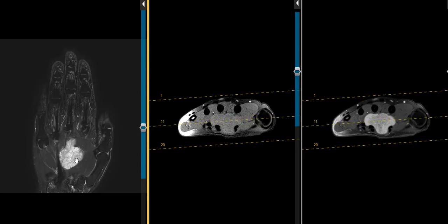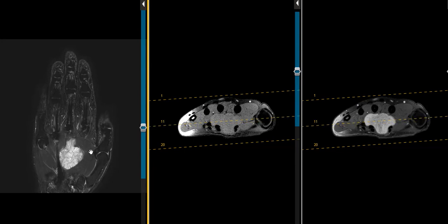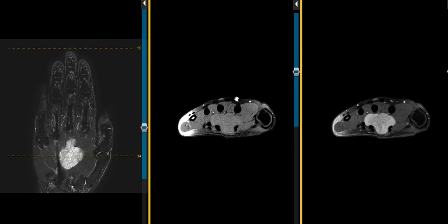It has well-defined margins, and within the lesion, you see these little septae, these little separations. So we can see that this is a really hyper-intense mass, but it's not a cyst. It has this internal structure, so it's a solid lesion. And the next question is, would this thing enhance, or what are their enhancement patterns? Is it enhancing around the periphery, or just patchy enhancement, or uniform enhancement, or no enhancement?